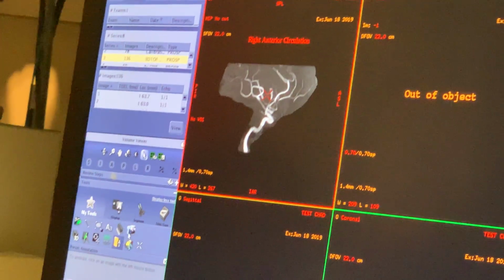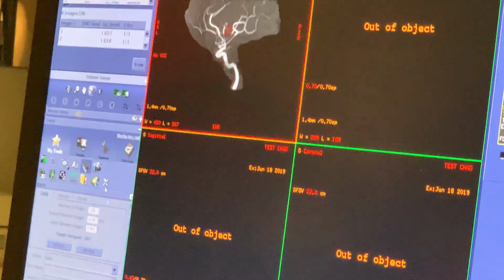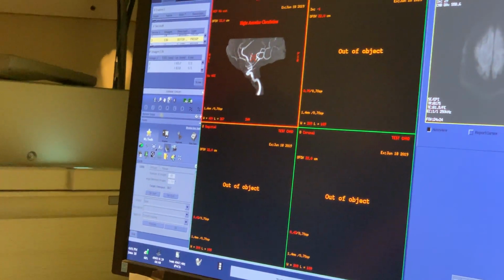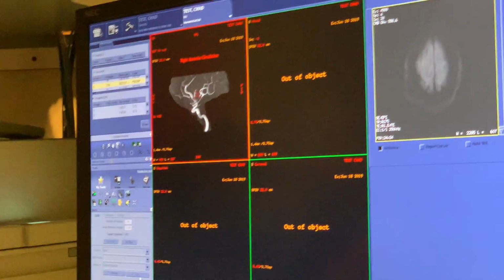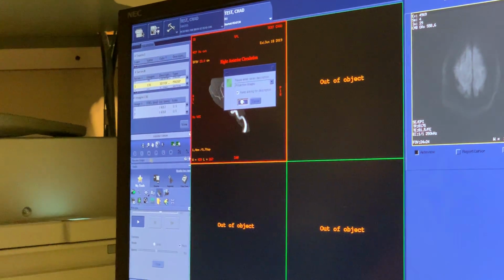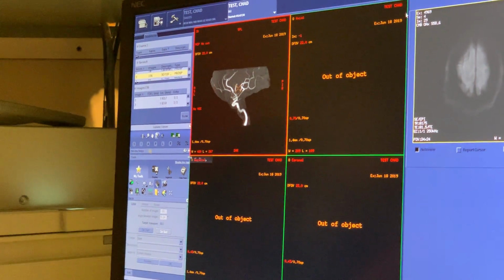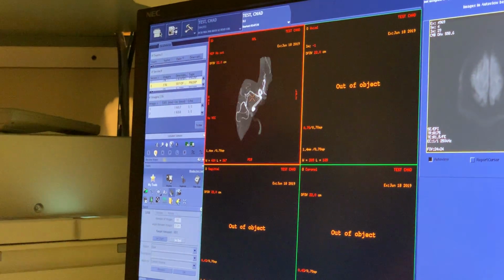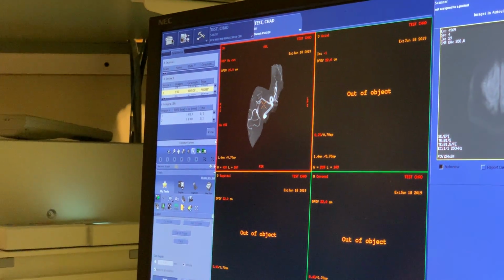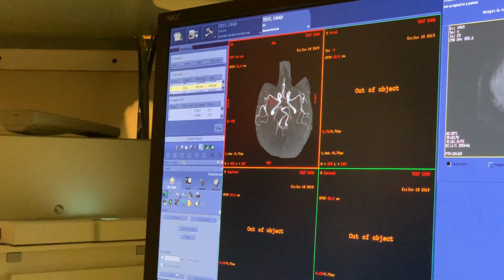Okay? So now that I've done that, same thing as before, start, go to the left side, hit end, and then type 36 again. And then I hit OK. It's going to come up with this box. I just click OK, and it's going to spin it in the background. Next thing I want to do is get rid of this right, go back to the inferior view, go back to the cutout, and then I want to undo. Now this has multiple undos on the scanner.